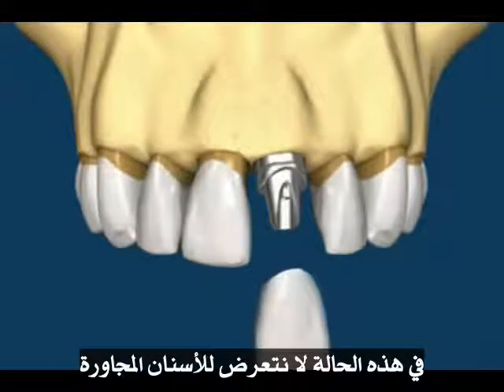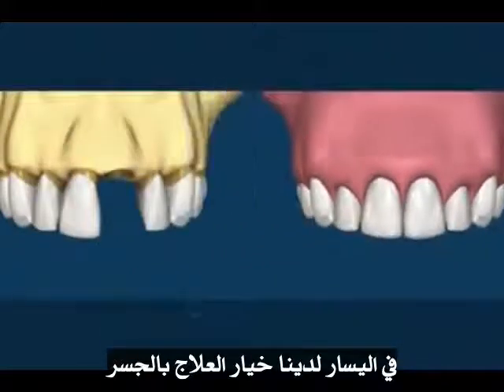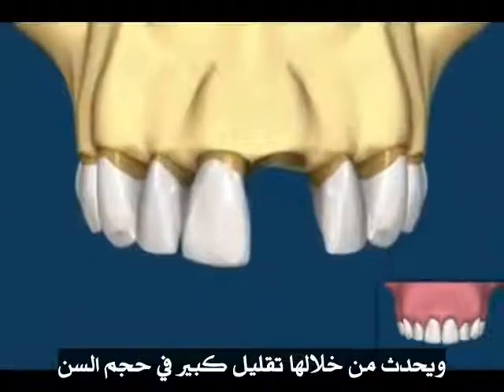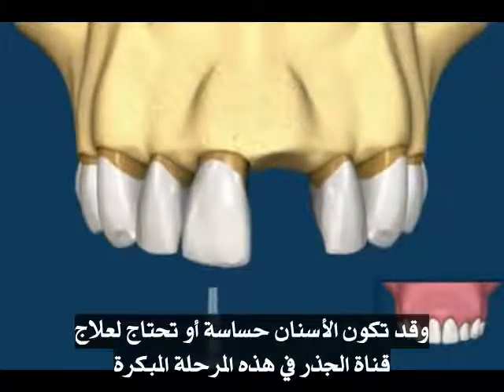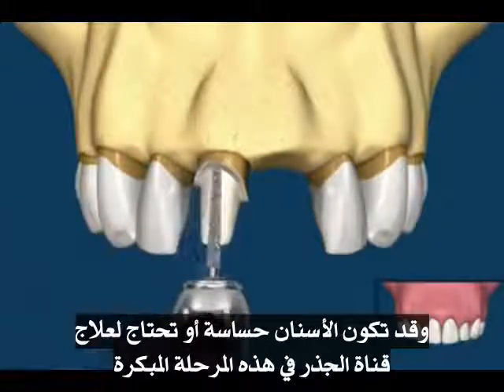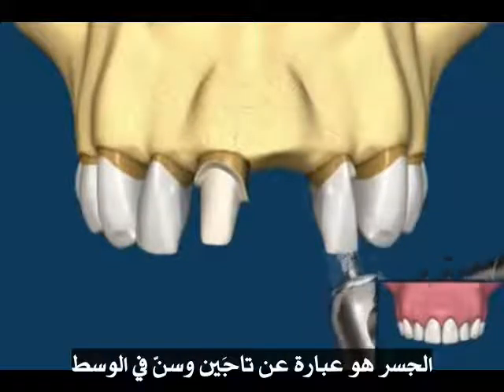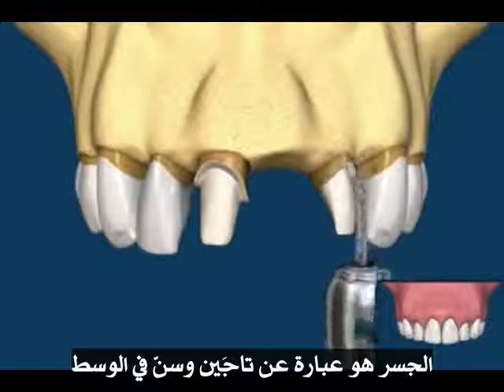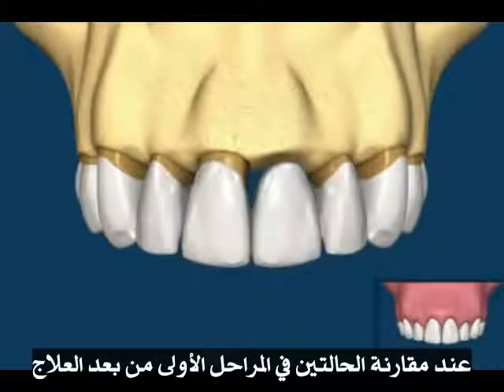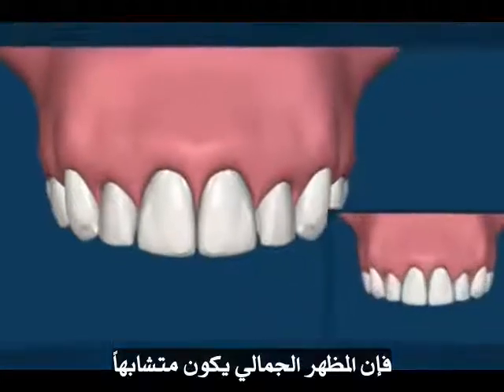In this situation, we do not involve the adjacent teeth. On the left, we have the bridge option. Here we must cut down the adjacent teeth. There is significant tooth reduction, and the teeth may become sensitive or even need root canal treatment at this early stage of the process. A bridge, which is basically two crowns with a tooth in the middle, is cemented on top of these prepared teeth. Comparing the two situations at the early stages of post-treatment shows that they can have similar cosmetic results.